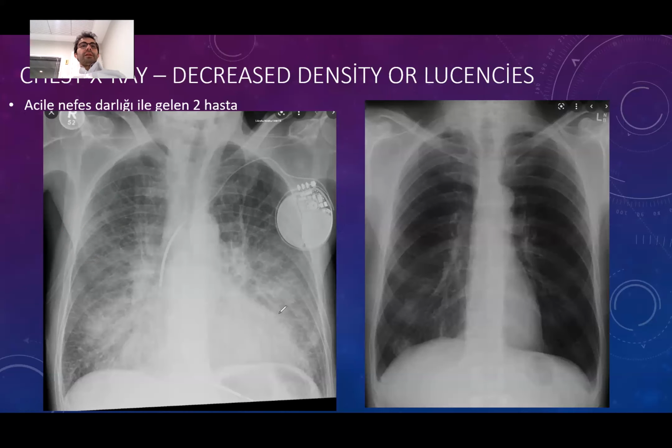So there can be some areas of pneumonia here, and because there are consolidations all around, we probably cannot define them. So we should always also consider things which can be accompanying, which can be happening at the same time in all of the patients. Okay.